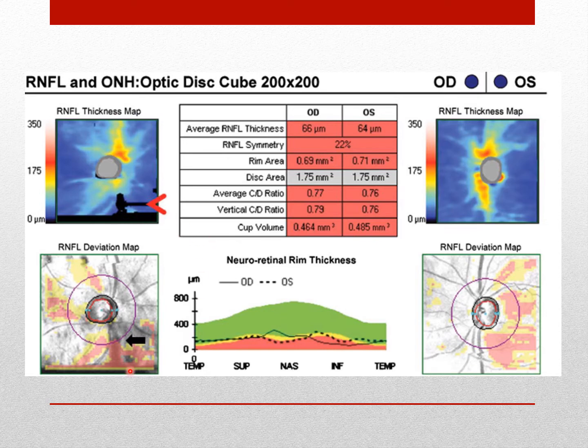But you see that translate here in the deviation map, right? Follow the outline of the same error, all this red here, showing that there's a nerve fiber loss because it's just parts missing, that's all. So this is an artifact. It's not a true nerve fiber loss. But thankfully, only a portion of that error is taken into calculation for the nerve fiber thickness. And I'll show you in the plot soon. But here and over here, you can assume that that is true nerve fiber loss.